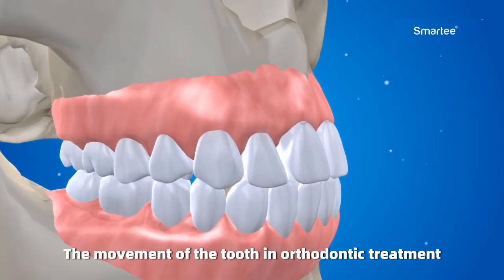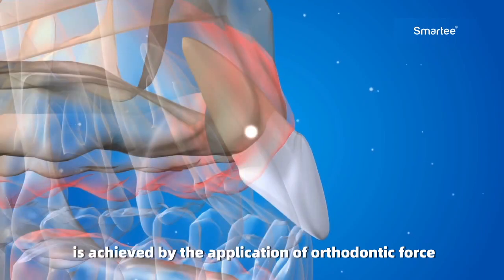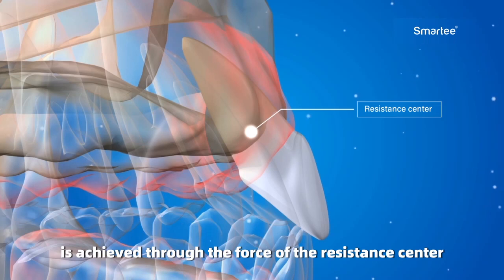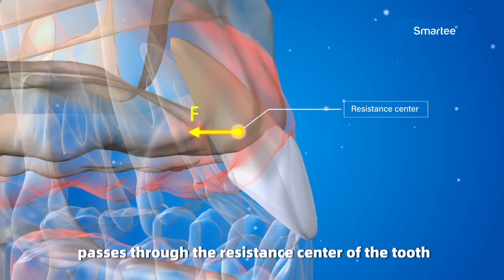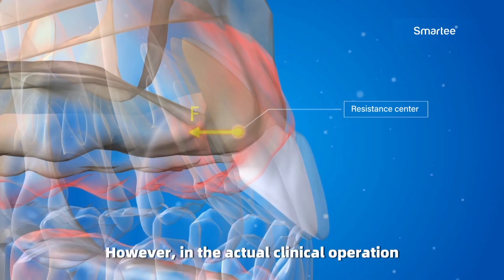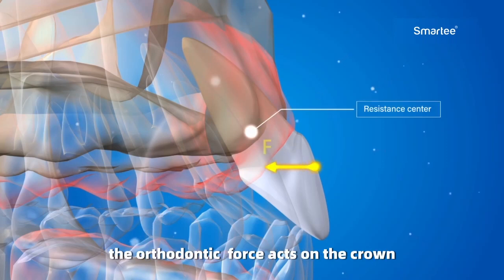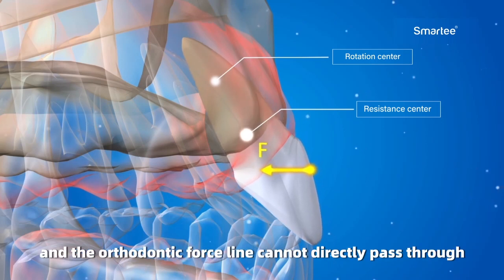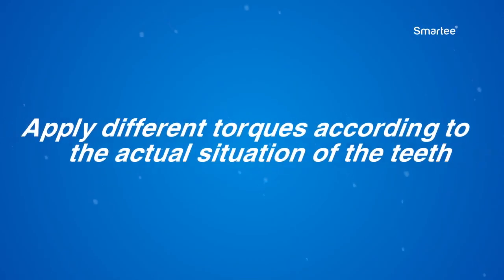The movement of the tooth in orthodontic treatment is achieved by the application of orthodontic force. The ideal orthodontic force is achieved through the force of the resistance center. When the force line of the orthodontic force passes through the resistance center, the tooth performs a translational movement. However, in actual clinical operation, the orthodontic force acts on the crown, and the orthodontic force line cannot directly pass through the resistance center, so the tooth rotates.